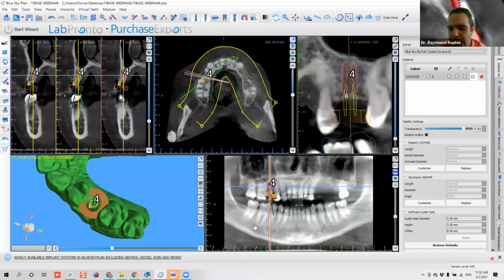And well, for you guys, if for some reason you're doing surgical guides and your sleeves fit really, really tight when you're placing them, this webinar will be good for you, because now I will show you how to make this hole in the guide space loose enough, or perfect, for your sleeves to fit in, okay?